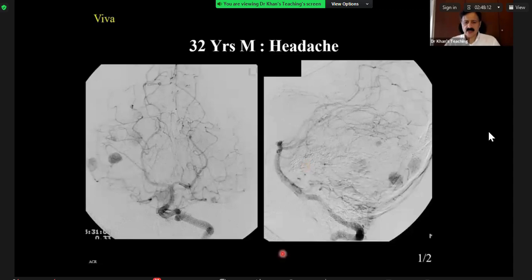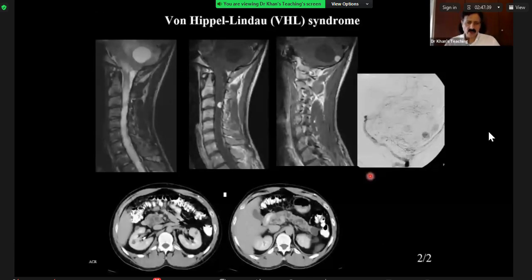That kind of confusion will always happen, and that is why my advice is to revise it before the exam. Now, this is a vertebral artery angiogram, and there is cross-filling from the other side. And you can see what we call multiple tumor blushes. So the word here is tumor blushes. These are very vascular tumors, and of course, we are doing von Hippel-Lindau. So this was von Hippel-Lindau.